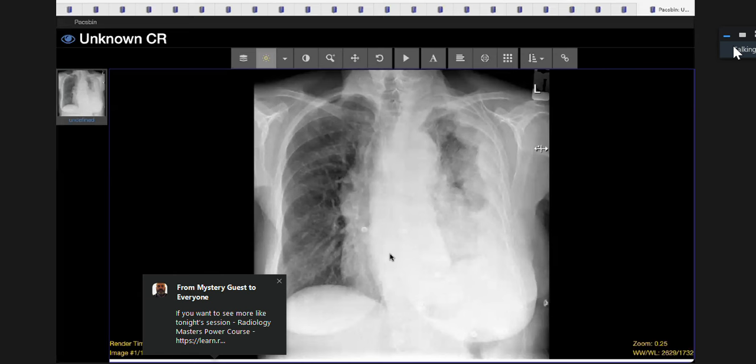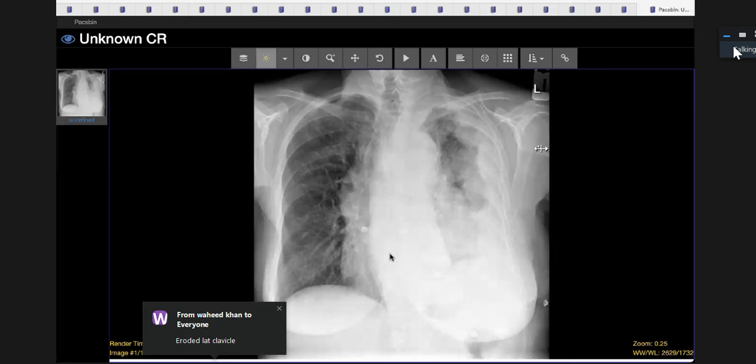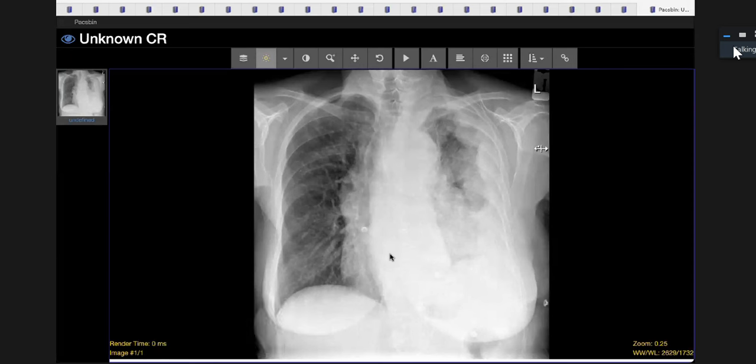So it's not a breast lesion. This is lung, and it's actually pleural, because you can see it encasing. This is how I describe it: lobulated soft tissue, pleural based, encasing the mediastinal and pleural surfaces. So medially and laterally is what I'm trying to say.